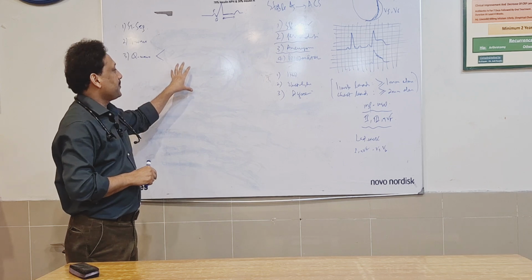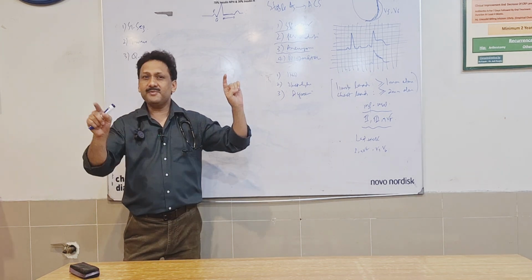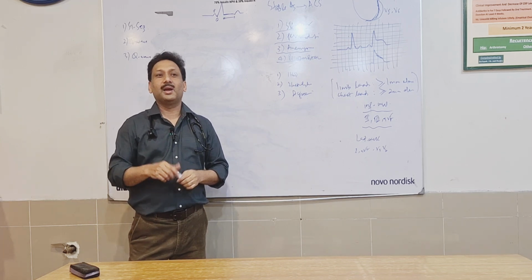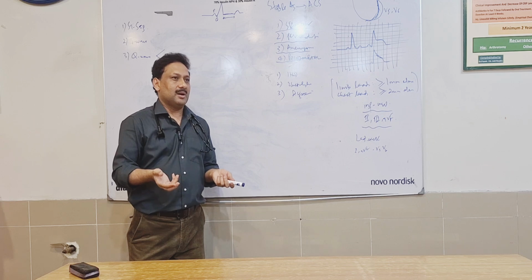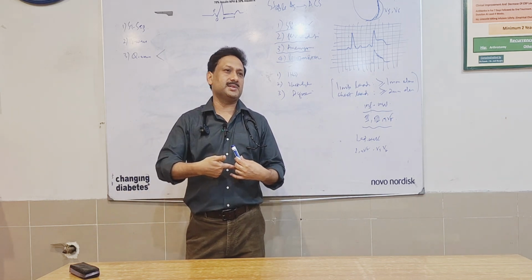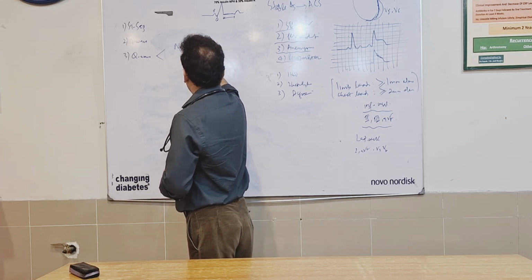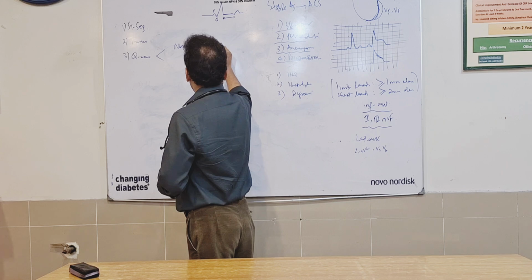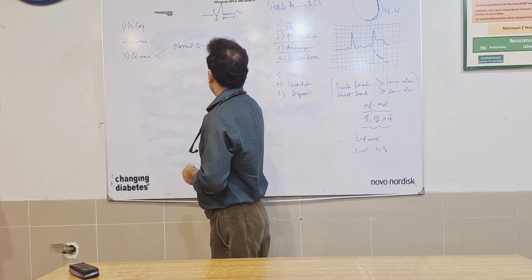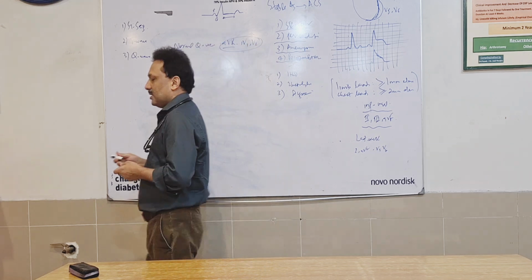Now move on to the Q waves. Q waves again can be normal. Again, the same rule: in the lead which is exactly opposite to the normal cardiac axis lead. So in AVR, you would be seeing a normal Q wave. In the same way, leads V1, V2 can have normal Q waves.